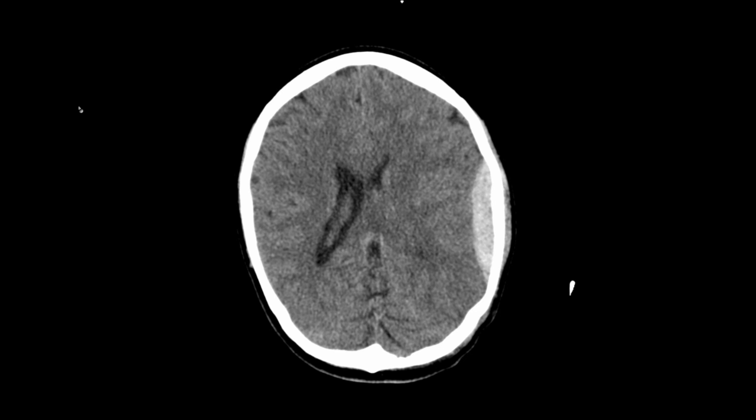Here we have the CT showing asymmetry with a bright area on the left side of the patient laterally. It is associated with a soft tissue swelling outside the skull vault where she hit her head. No such similar changes are seen on the opposite side. Asymmetry is important when looking at radiological images.